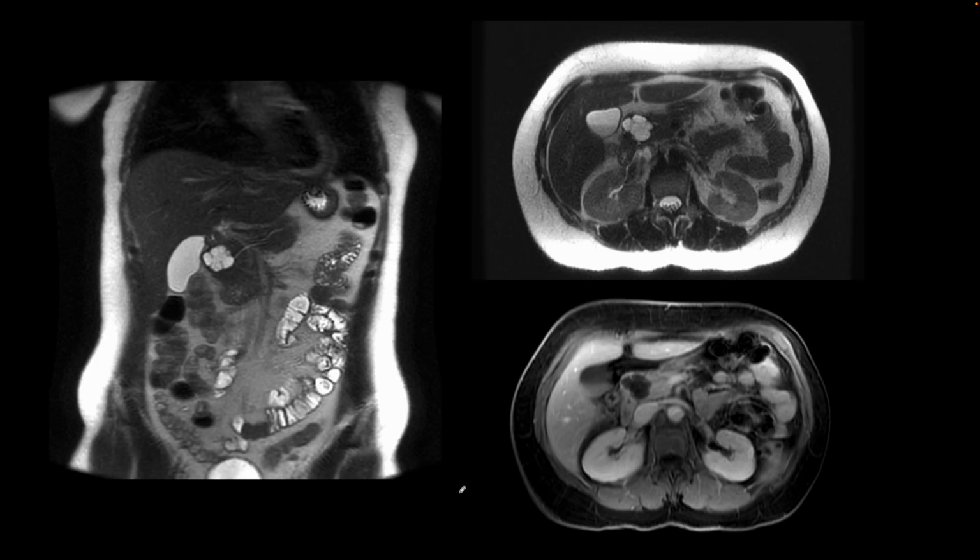Here is another patient, and on their MR, we have an incidental finding in the pancreas. We see a complex cystic lesion, and it shows some septations that we see here. It is attached to the pancreatic duct like we see right there and here. And on the post-contrast images, there is some septal enhancement, but there is no nodular focal enhancement, which would be a suspicious finding which may develop into pancreatic adenocarcinoma.